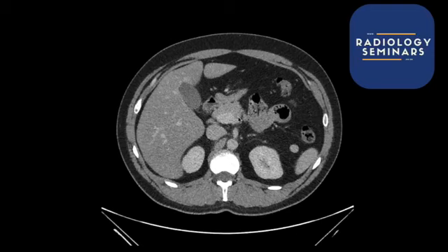Something along those lines. To the point that if you've got a lot of air sitting in the upper abdomen, and you haven't seen anything else, you could literally say, in the absence of any other findings, there's a predominance of intra-abdominal free air, predominantly in the upper abdomen. This would most likely be consistent with a perforated duodenal ulcer, although I have not been able to identify that on the CT scan. It can happen.